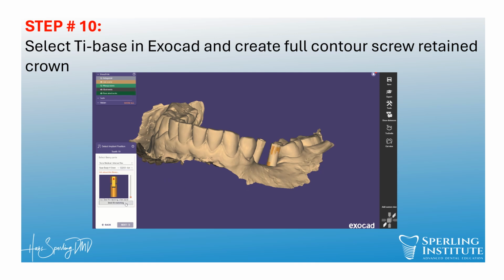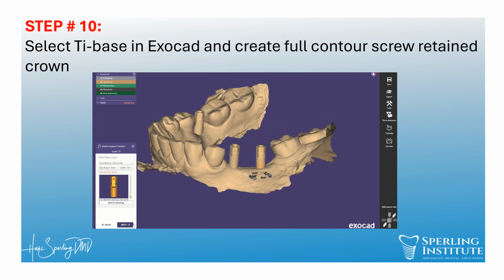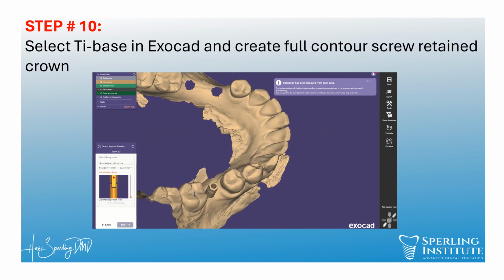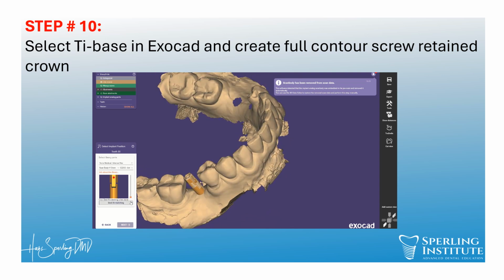We select where our best fit matching for our abutment is. That's in the right spot. And we do the same thing for tooth number 20. And we can do the same thing for tooth number 30, but you have to select where the part of that abutment is.